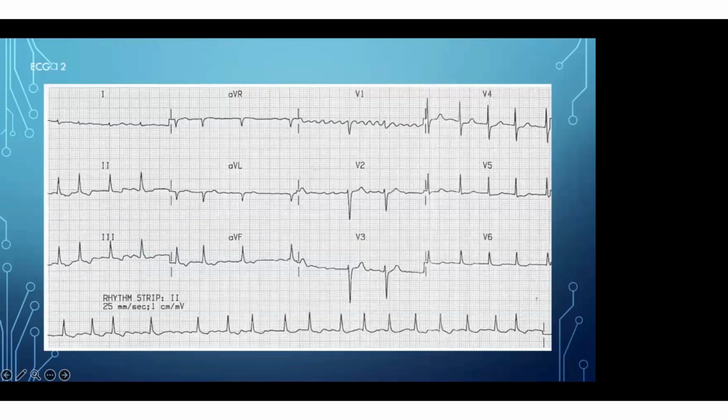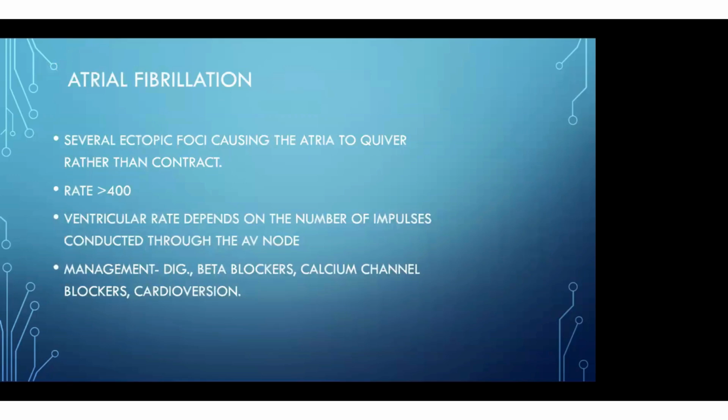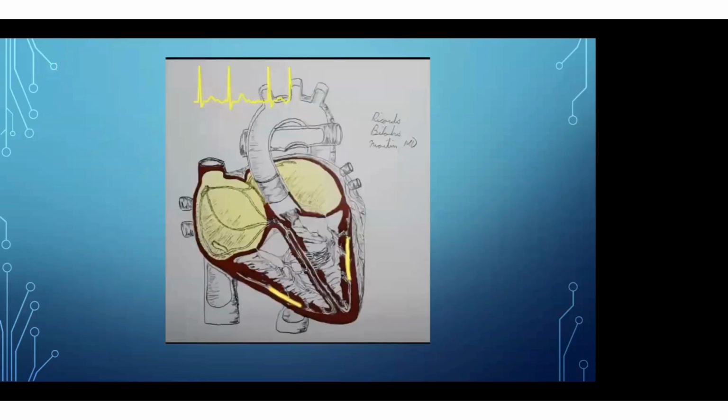Can you tell the diagnosis? This is a very clear diagnosis, a very common diagnosis of atrial arrhythmia. It's one type of SVT. Atrial fibrillation. Very good, atrial fibrillation. There are absent P waves and varying RR intervals. Okay, you will be seeing atrial fibrillation.